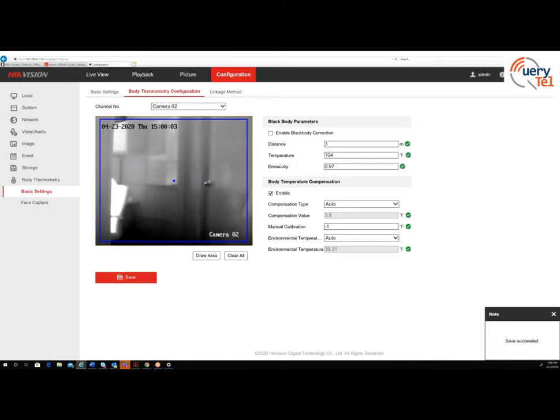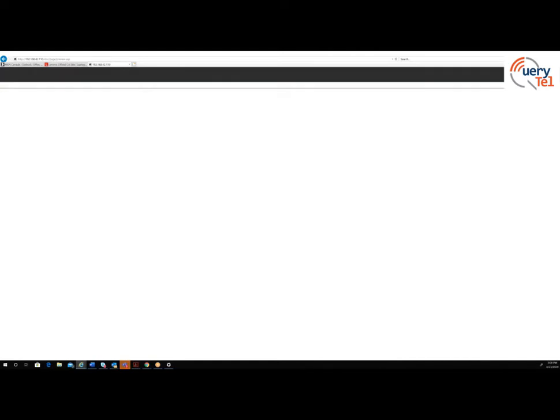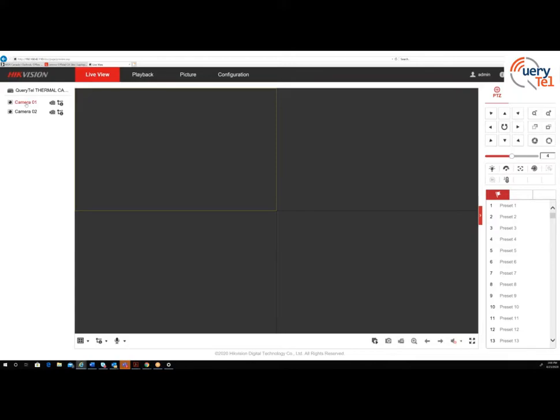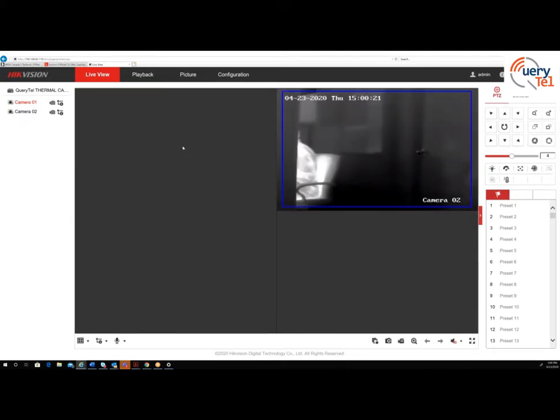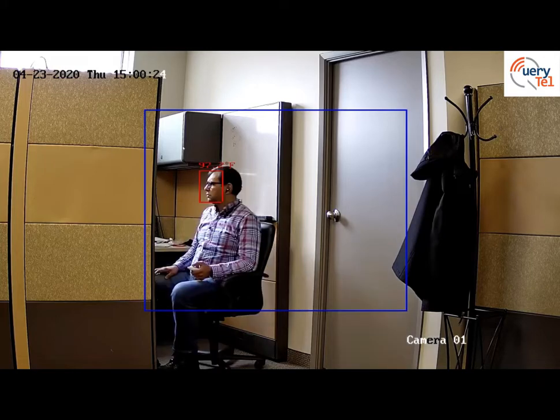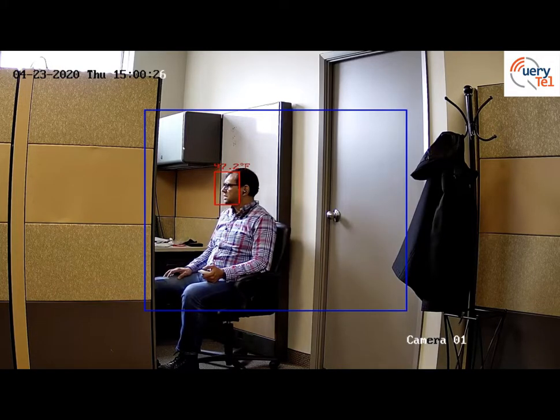See what it does. And then I'm going to live view. And once I'm in the live view, I play this camera. So now it's showing me 97.3, and I did 1, so I'm at that.